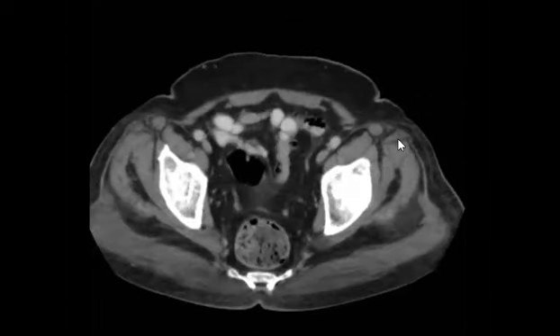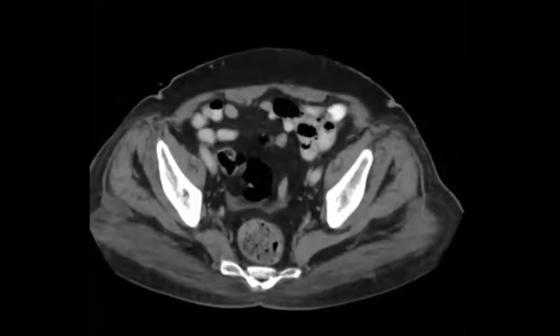in one time. Yeah, Ala: laryngeal mass, cervical lymphadenopathy, thyroid nodule, bilateral axillary lymph nodes, anterior mediastinal mass, pulmonary nodule, right renal mass, lytic bony lesions. I will see.